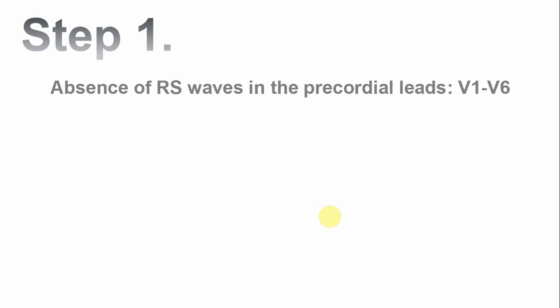However, we don't see this that often. It's not found every day. You might find it maybe once or twice a year. So if this particular criteria is present, the patient has got a VT. However, the sensitivity is not that great, only 21%.